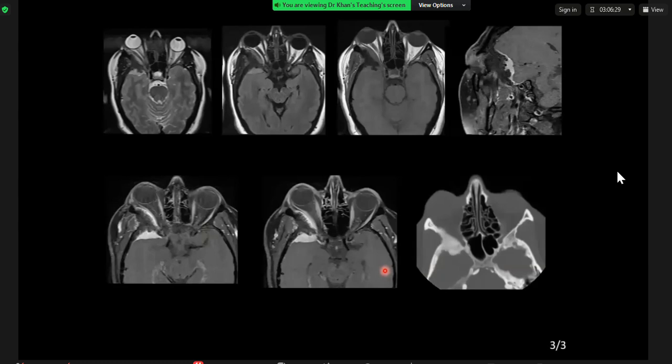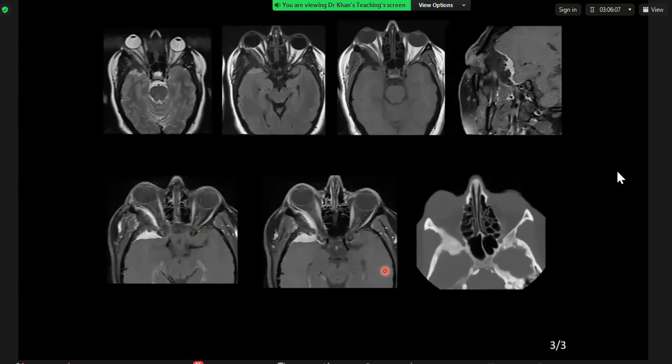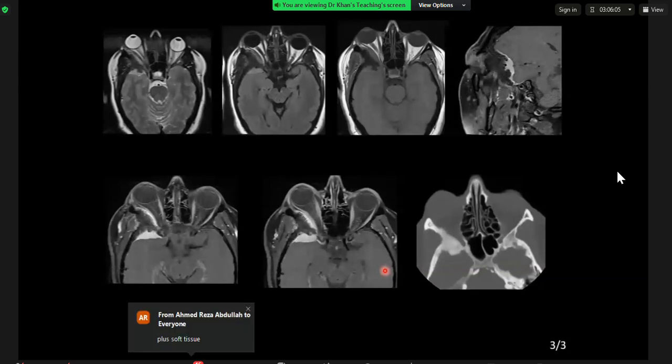So when we're comparing with the CT, we can see that where there was an area of bony hyperostosis, there are surrounding areas of enhancement around that lesion, which is tracking from the orbit, going around the bone, and it all appears extra-axial to me. So there is enhancement in that area, and this enhancement could be tracking along the meninges, I think.